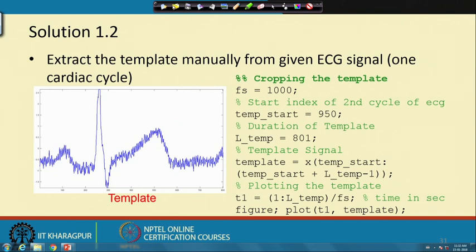There is a good amount of noise, but this is good enough to see not only the amount of noise, but also that in the ECG signal most of the energy of the signal is concentrated near the QRS complex, and the rest of it is in P and T. In between, from the end of T to the beginning of P, there is supposed to be an isoelectric line, or no electrical activity. So, whatever is there is noise.